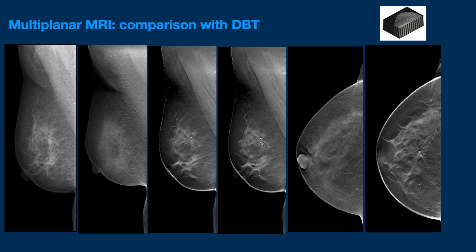There is a multi-layer mammography, as you know, and that is DBT. This also involves the acquisition of a volume, which is then subdivided into slices, generally half to 1 mm thick, using dedicated software. An interesting methodology affected by many artifacts resulting from the type of acquisition, which is not a real three-dimensional one. However, it can forgive some positioning errors, as you can see, and can solve the summation artifacts.